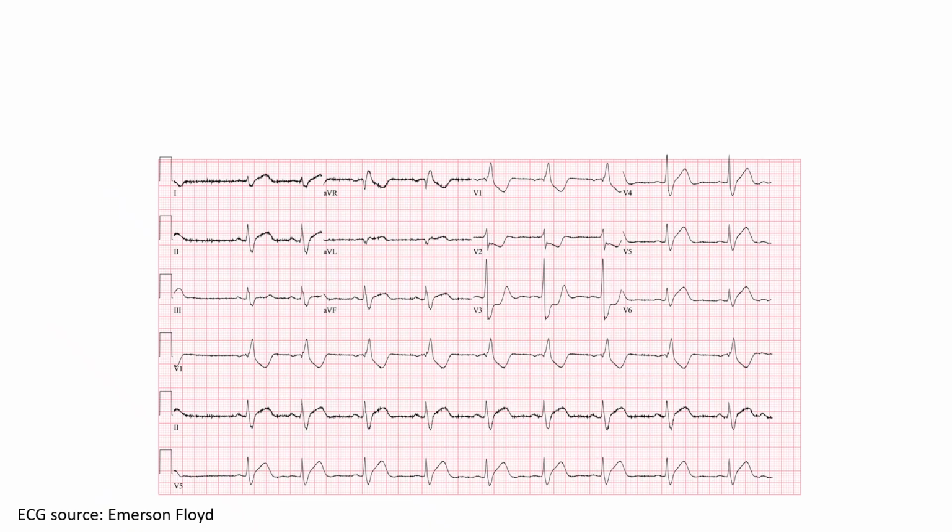So a technician hands me an ECG. Here's how I look at it in 5 seconds. First, clinical context gives me a sense of what to look for. Then I look at the rhythm strip to establish an AV relationship. Then I look at the leads.